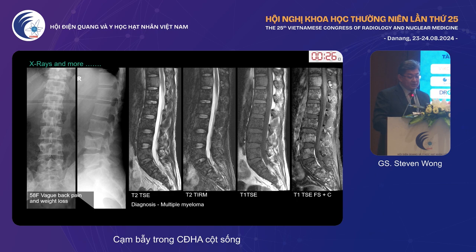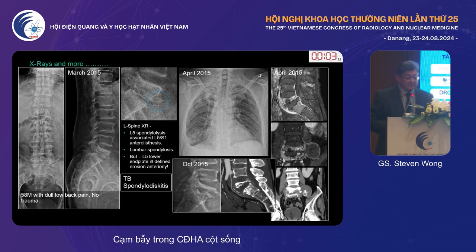In this patient, the X-ray is fairly normal. It's just L4-5 and L5 that look a little bit more hyperdense. But once you do the MR, you can see a very mottled, permeative appearance to the marrow. This is actually early-stage multiple myeloma marrow change. It becomes a little bit more homogeneous in the second and third phase of the disease. Right.